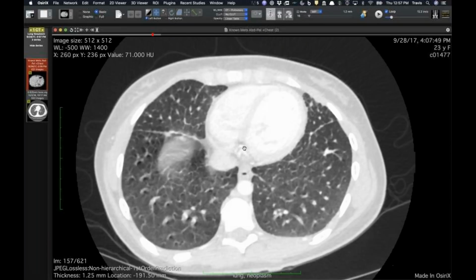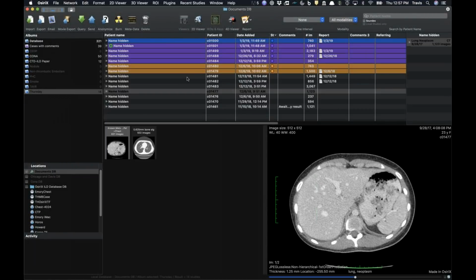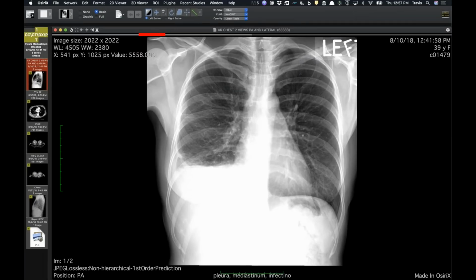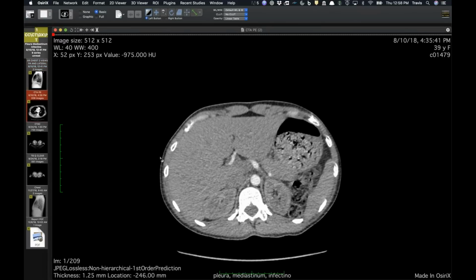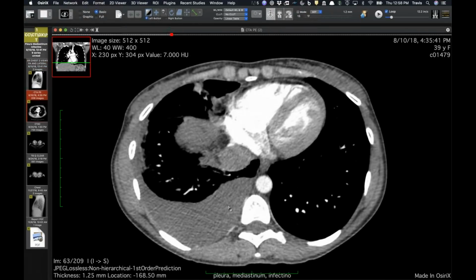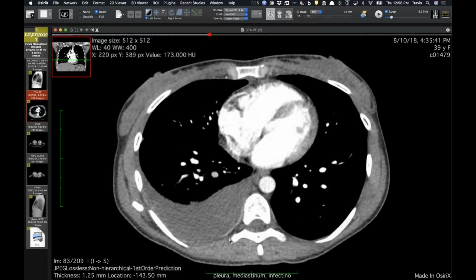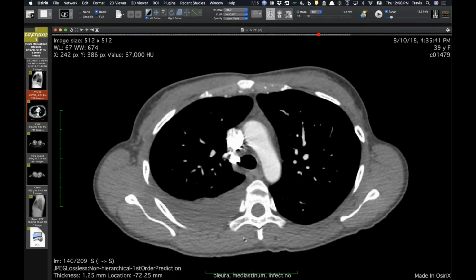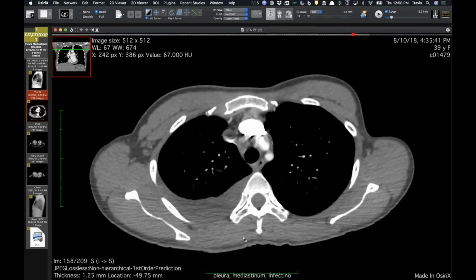Wow. All right, and I'll show one more just to finish off. Let's see, this one. This is a young woman, she's 39. She came in with a unilateral pleural effusion. Of course, in outpatients, with no history, you think about prior pneumonia with some sort of infected or parapneumonic effusion or maybe empyema, or cancer. And she didn't have a history of malignancy. She's fairly young, so you hope it's not malignancy.